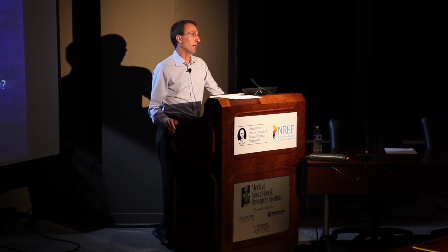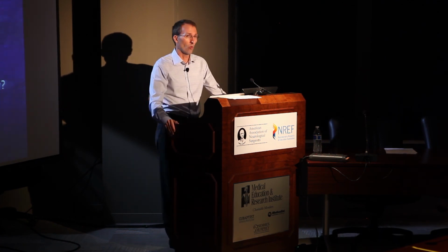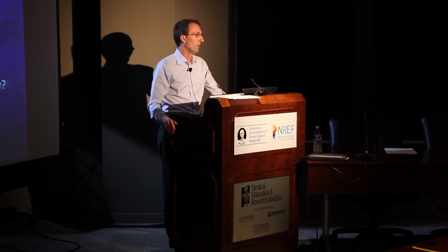Where are your most likely arterial inputs that you can access? What are your transvenous pathways? Where actually is the fistula located? What if you can't easily cure this? Where do you want to tell your surgeon to look? I find it extremely useful.